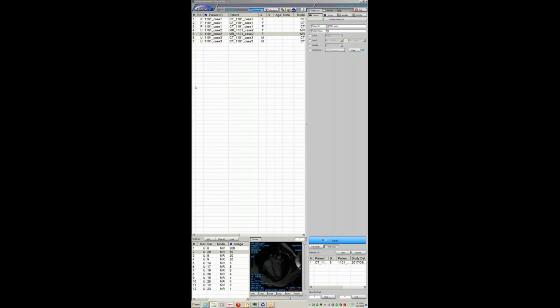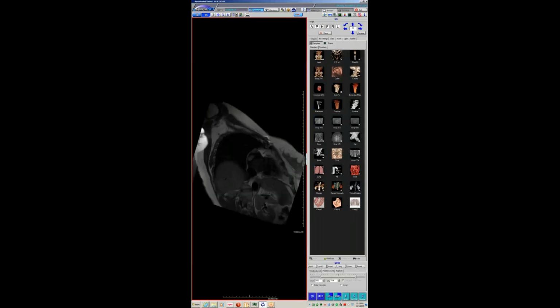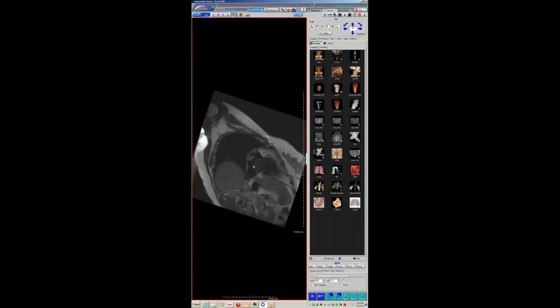Let me pull over, it got closed. So while I do that, I'll show this. It's a woman with multiple myxomas in the right atrium here. And if you hear the word multiple myxomas, you're obviously going to think of Carney's. And this was, sure enough, a patient with Carney's. I was just going to show because I have very nice echoes, here we go.